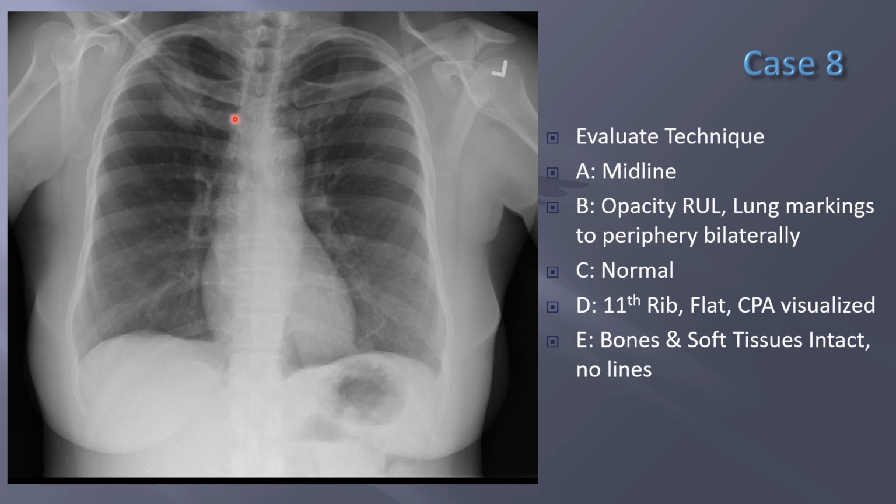Ribs. I don't see any rib fractures. I don't see any subcutaneous air. This indicated left side. I don't see any hardware, but I see a little subtle, very subtle finding. That's why you gotta look both sides. Now you see these markings here, that's your hilum. Again, that's just blood vessels that are coming off to feed the lung parenchyma. So that's kind of a normal appearance on both sides, but this is different than over here. So interpretation is that there's a right upper lung mass there.